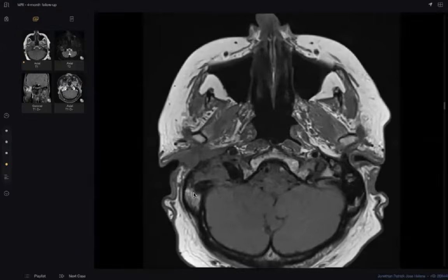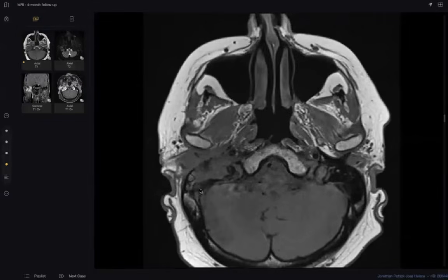Yes, maybe infiltrated. And look here at the ICA. What happened to the ICA? It appears to be narrowed. Hazed. Yes. So maybe a sign of invasion. A sign of invasion. So what's your final diagnosis?